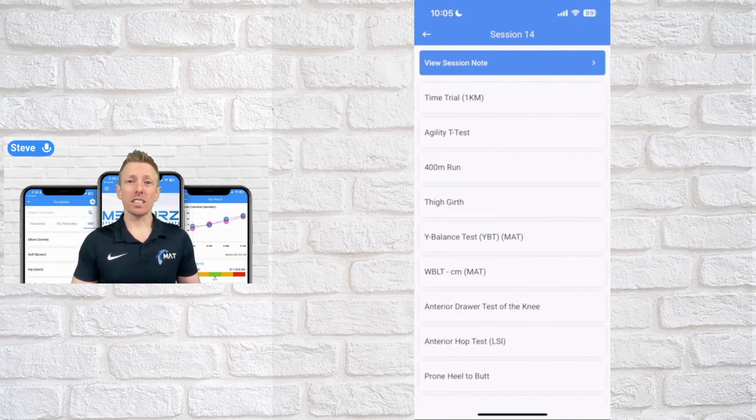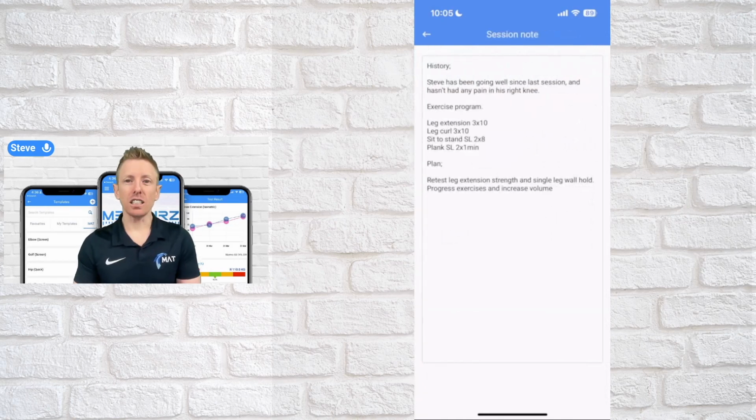Now, you'll see that I've got a session review up here. So this is what you see after you've run a session. You can go back and have a look at all the data and explain that to your patients and your clients. So you'll see initially you've got the notes.